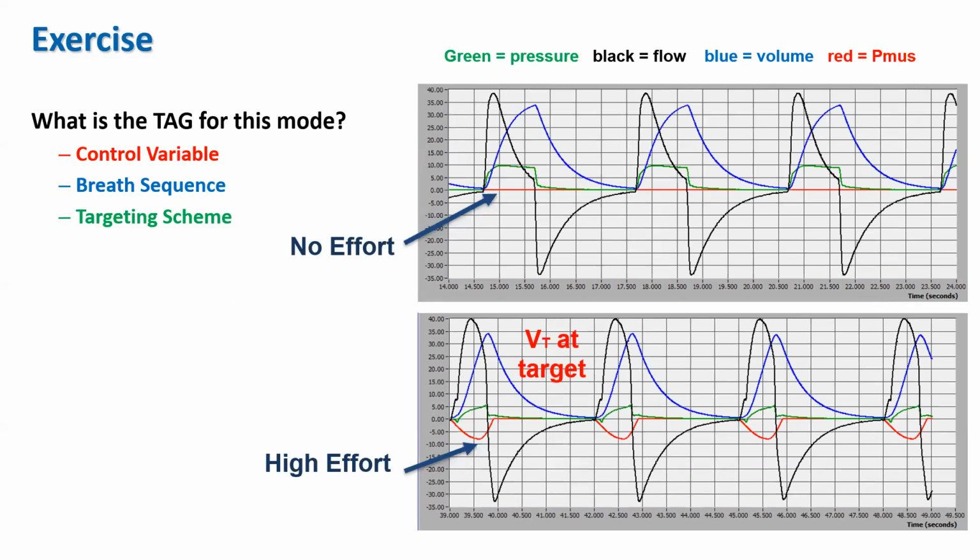Here's another exercise. Here we see the same waveforms as before in the top when there's no inspiratory effort. But there's a difference. When the patient makes an inspiratory effort on the bottom, then, unlike before, the inspiratory pressure target goes down, but the tidal volume stays the same. Furthermore, the inspiratory time is decreased, meaning that the breaths are both patient-triggered and patient-cycled. Hence, we have the possibility of both mandatory breaths, where the patient doesn't do anything, and spontaneous breaths, where the patient makes inspiratory efforts. Furthermore, when there are spontaneous breaths, the mandatory breaths are suppressed.